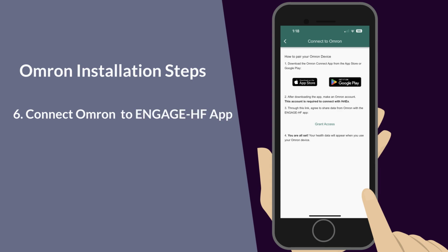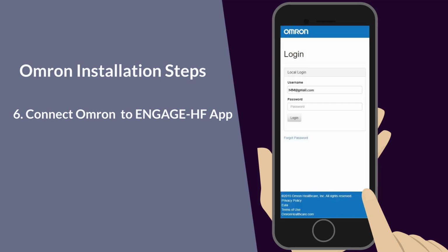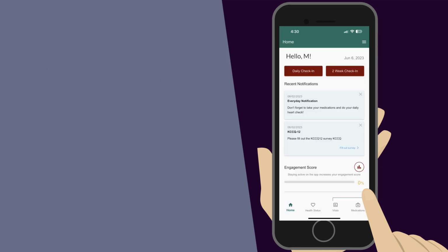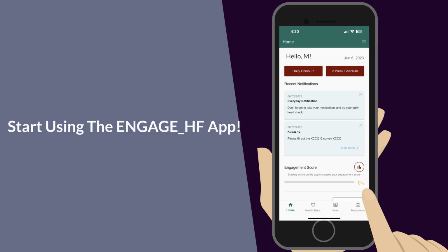Now, let's go back to the Engage HF app. Tap on Grant Access to connect the Engage HF app with the Omron Connect app. Log into the Omron Connect app using your username and password. Once you are logged in, give permission to access your data from here. That's it. Everything is ready, and now you can start using the Engage HF app.